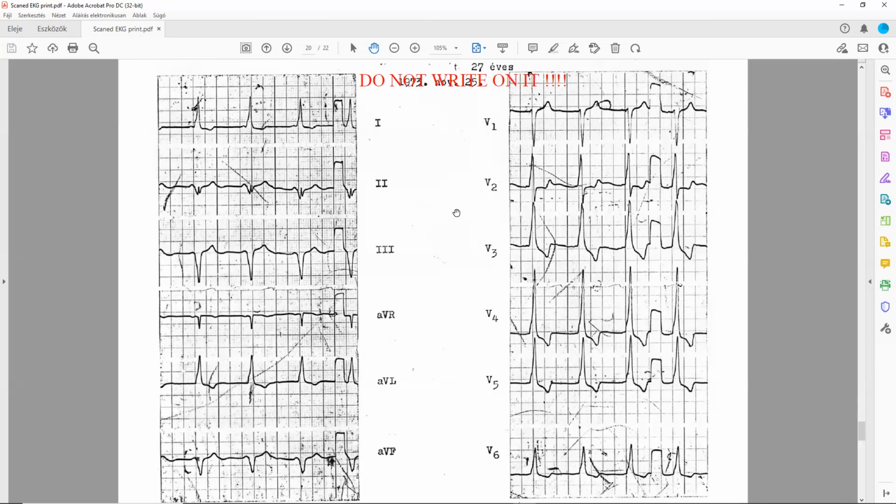Is it rhythmic or not? I want to say it is rhythmic, except for what happens at that point. What is this? That's what I was confused about. Now, what about this square signal? Is it an elongated ST?